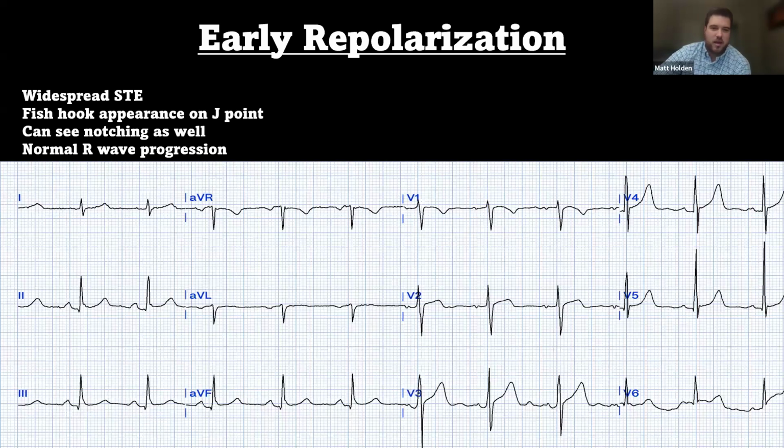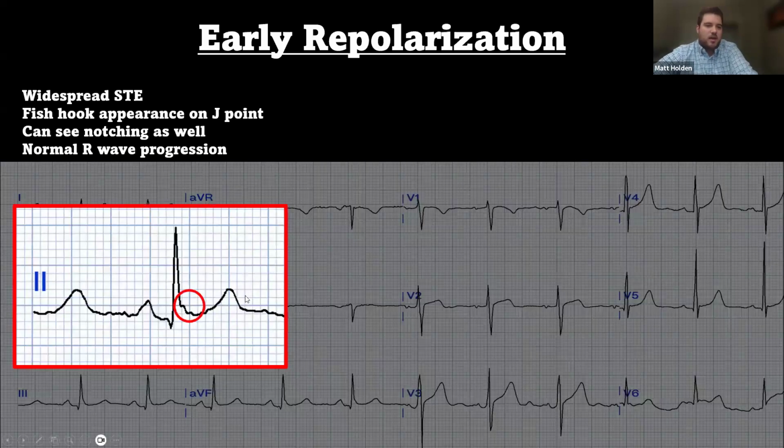So in this, we're going to have some ST elevation. And here you can see in lead 2, there's that little notch right there. And this is kind of normal-ish. I think I did see a couple years ago, and I'm sure Jennifer could correct me on this, they're thinking that it's no longer super benign, and that for some patients who are older, over 50, 60, it might be more of a problem than calling it benign. So they're calling it more early repol.